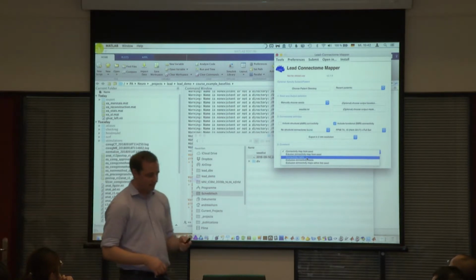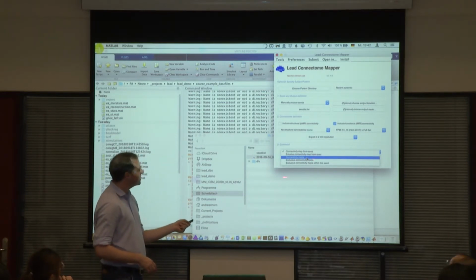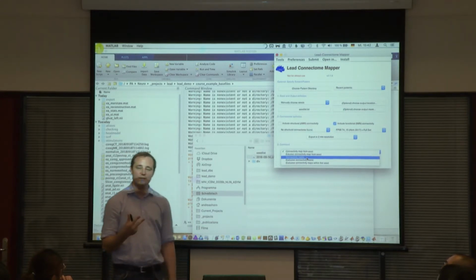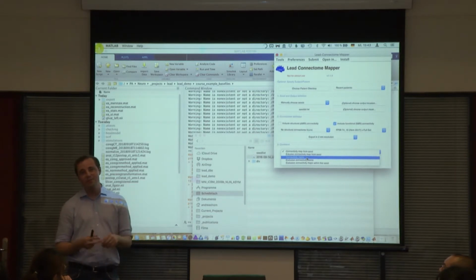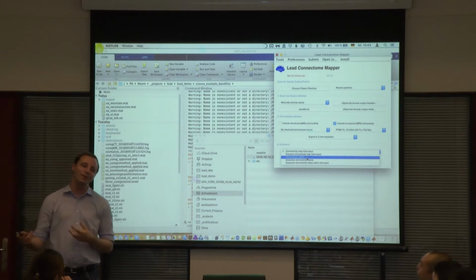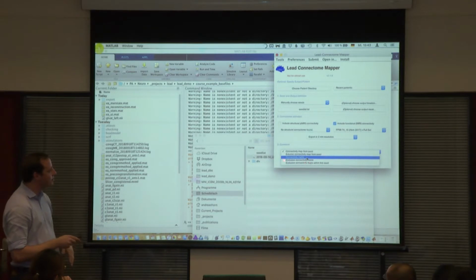Okay, but so 2 things basically: connectivity map from seed or connectivity matrix. The rest is more or less not so important, but you could also have what's called exclusive connectivity map from seed. That would be if you have 3 seeds, then it would use the partial connectivity, partial correlations in fMRI, but use a slightly different thing in diffusion MRI. So that's why we don't call it partial, we call it exclusive connectivity. So it's what this region is connected to, accounting for the other 2. It's not so important, I think. And the same for exclusive connectivity matrix.